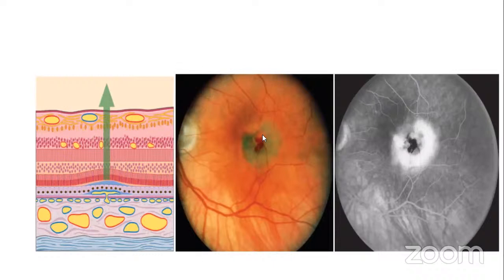Yeah. So this is what it looks like in this patient. So you're seeing that, oh, there are bleeds, there is new vascularization, and this is your late film. Late film because the vessels have emptied out. But I told you about something that is normal. You have a crescentic patch of hyperfluorescence around the disc. Okay, this is normal.